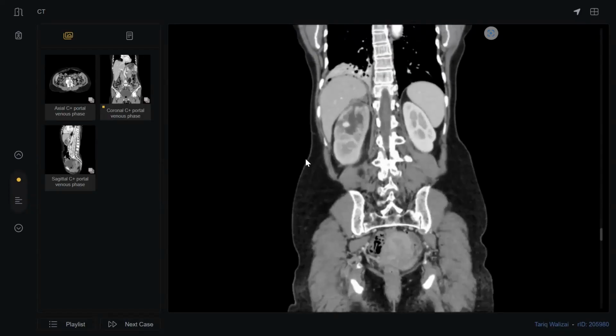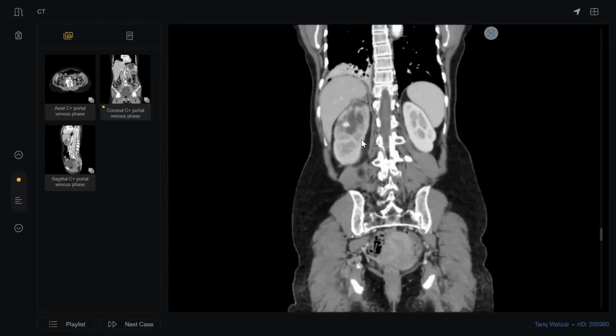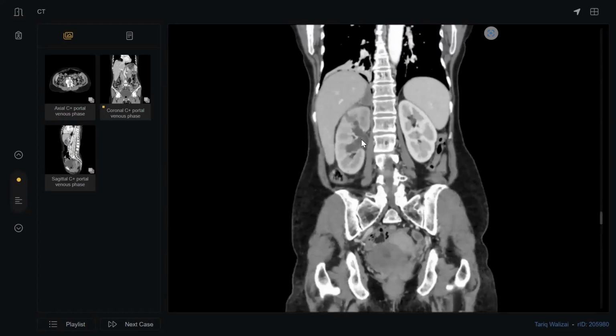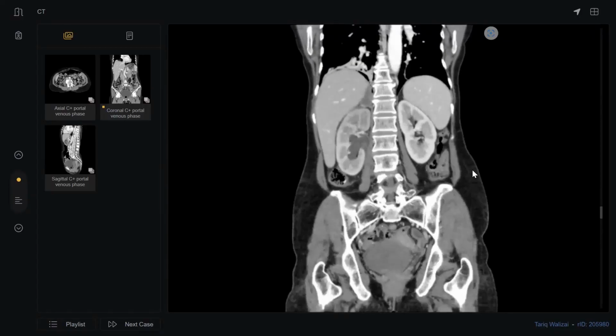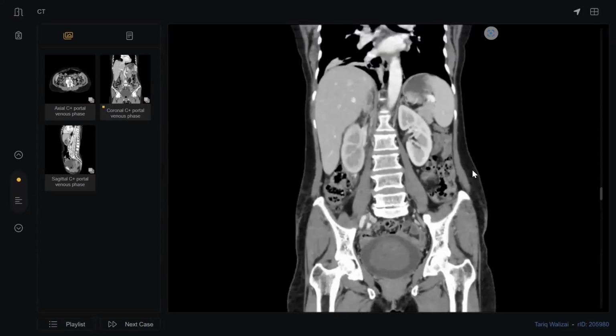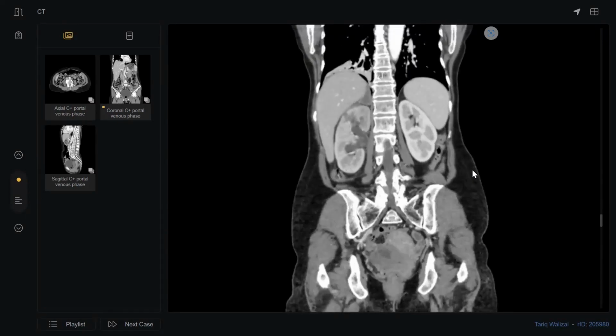Look here. Can vasculitis cause these linear non-enhancing tracts? What other possibility could it be? What history should you ask about? Possibility of infarct is there, so I should ask about any thrombotic state, any history of thrombosis.